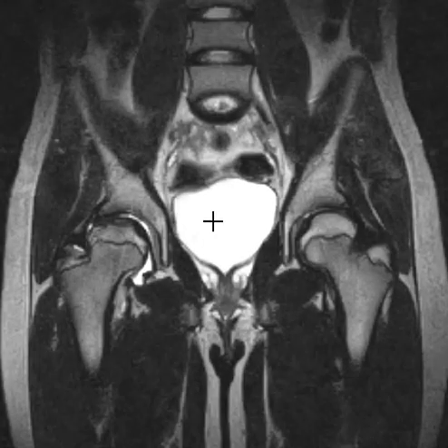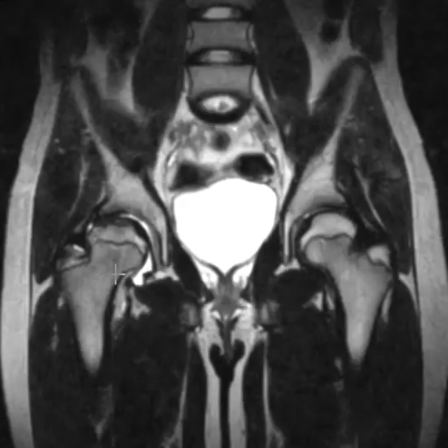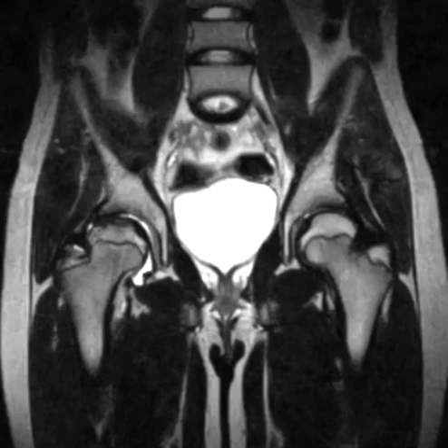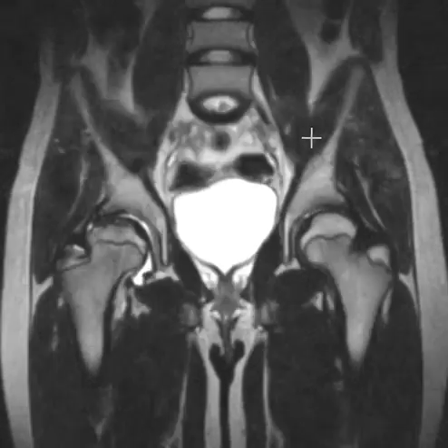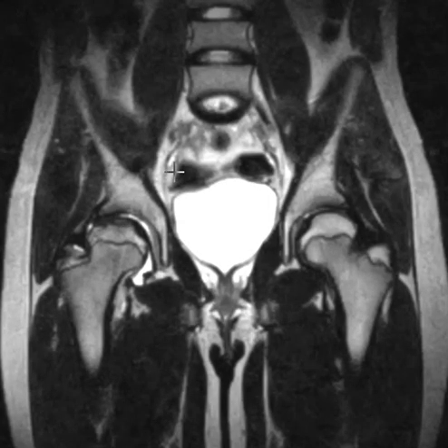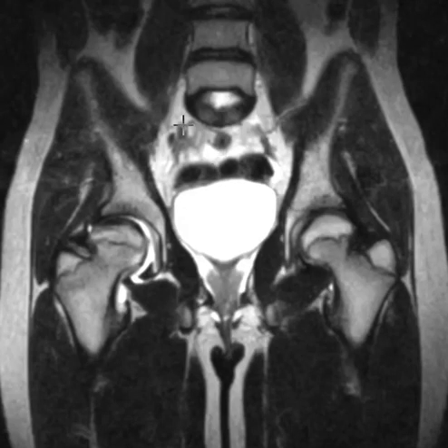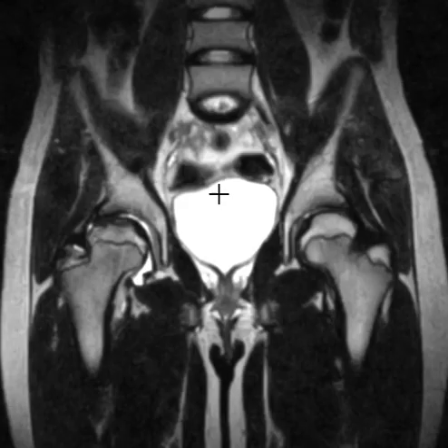So in a child, when you see avascular necrosis, it could be from prior trauma, it could be from some prior infection, it can also be idiopathic, related to Legg-Calvé-Perthes disease. That's usually younger people though, more like between 5 and 8 years old. So this patient is 15, so way too old for that, but maybe they had some chronic Perthes disease, and this is just residual. But with the patient being a little bit too old for the idiopathic spontaneous osteonecrosis, and the patient having a history of microtrauma being a gymnast, this is probably related to that.